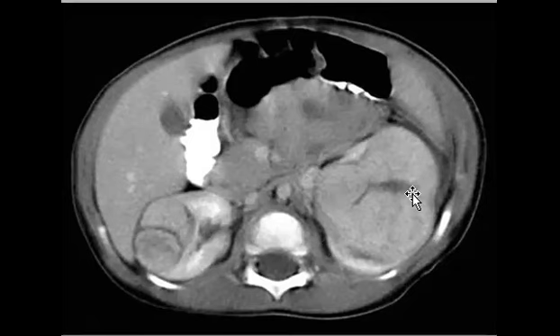I agree with you. And what will you look for? You will look for the renal vein and the IVC, because the clinician will wait for you to comment on the IVC and the renal veins. If you go up to the lung, you will try to find the metastases. Then don't forget the associations, because he is a child and you are looking for associated syndromes or disorders. So let's revise again what the associations could be.